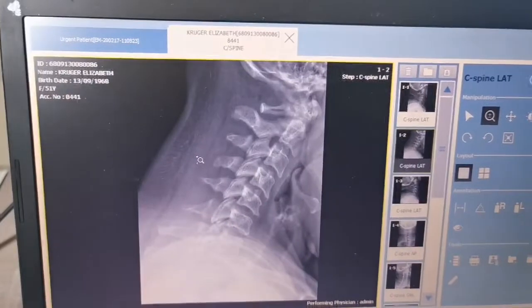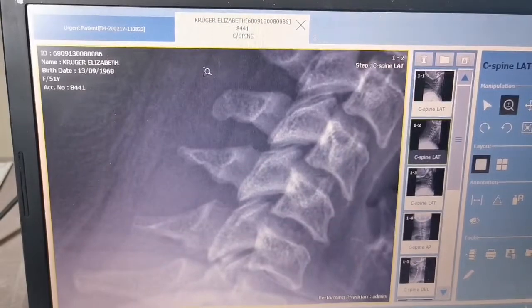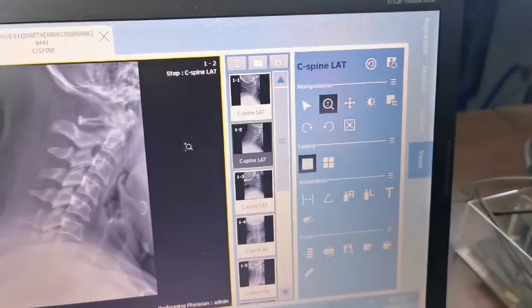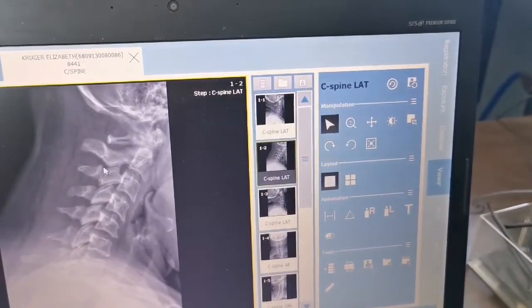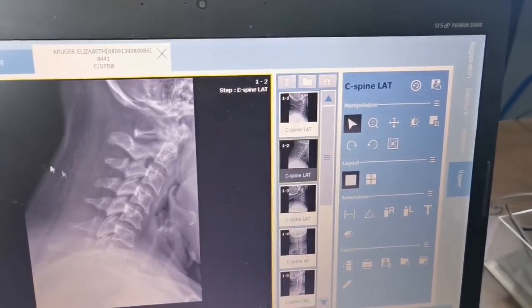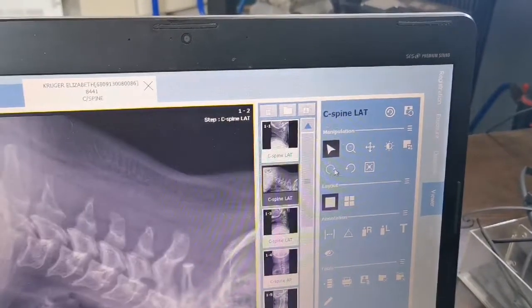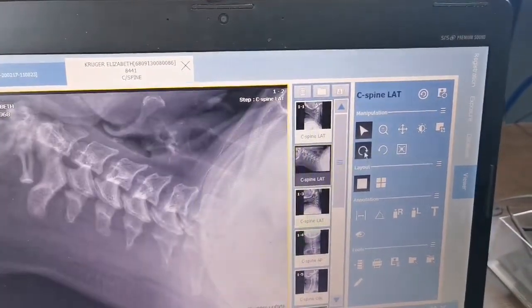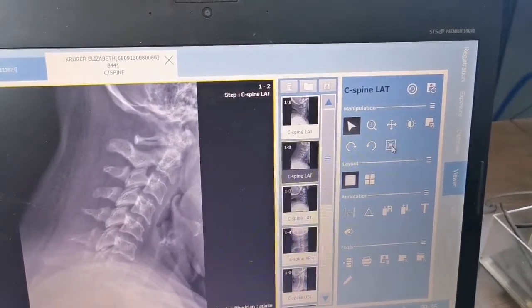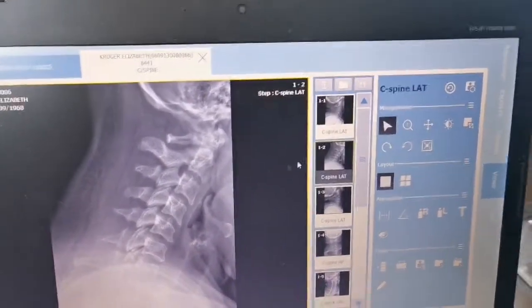What you're going to do, you're going to press left mouse button and hold it in, and then push the mouse up to zoom in, and you pull the mouse down to zoom out. You understand? Okay. And then we got the normal select. So there you can select a few areas. Let's say if you had an annotation, you can select the annotation and then delete it. So here we got flipping tools to flip the image around, which is quite a useful tool. And then this one, if you press that one, it fits the whole image into this part.